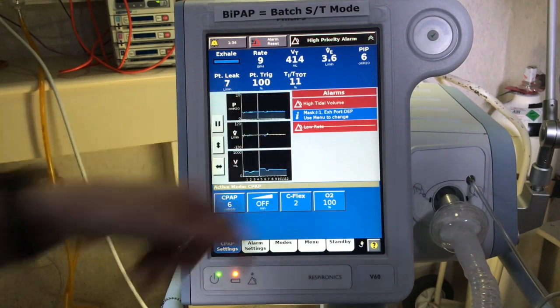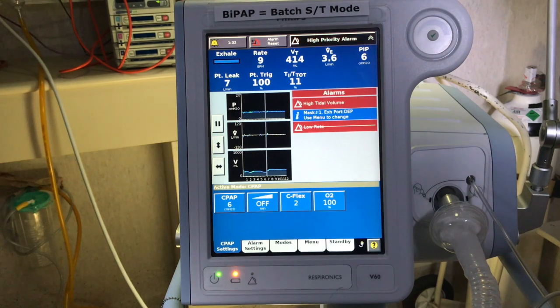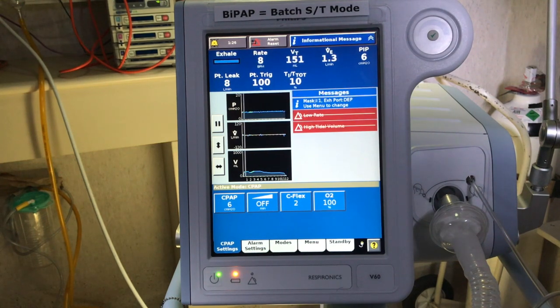And then this one here, the TI total, that one is something that's not often used by us, but basically it's the inspiratory time divided by the total cycle time over the last 8 breaths. So something not that useful to myself in my day-to-day job. So yeah, that is just a very quick summary of what we're looking at at the top there.